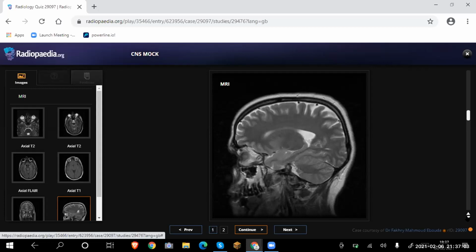And in hypotension, what those ones usually present with is contrast enhancement, diffuse dural thickening, and they have distension of the venous sinuses. Like in this one, there is stenosis, but in hypotension, there's distension. And in both of them could have tonsillar herniation. So that is common with both of them. And then in hypotension, they could also have subdural collections, like subdural hygroma.